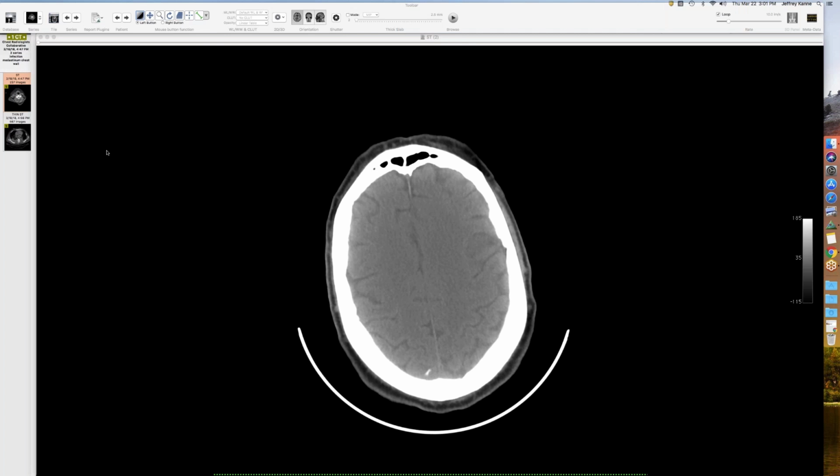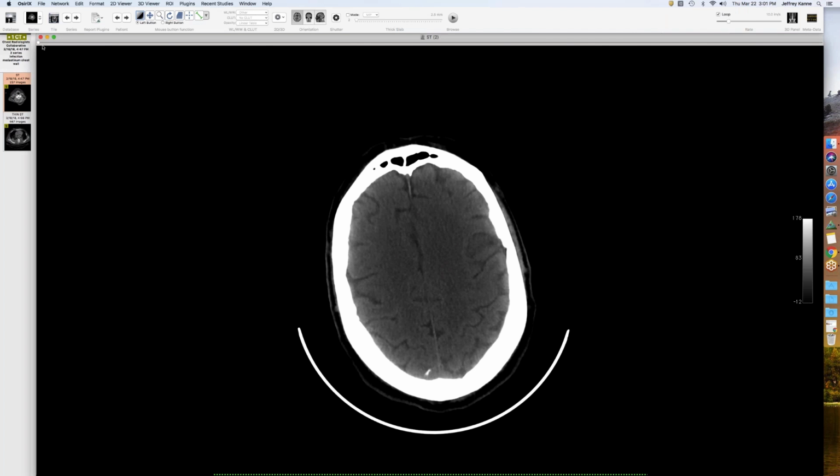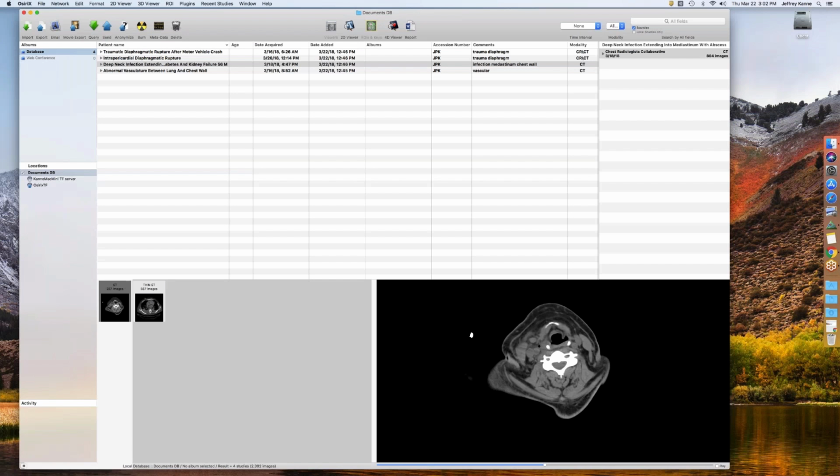Okay, makes sense. So it's basically a fistula, probably congenital. Congenital? Well, don't you think? Is that what you think, Jeff? No, I think it's probably acquired. Or acquired. It's sort of all these little tiny vessels, as opposed to a sequestration where you have one big vessel from the aorta. It looks more like a pseudo sequestration, but without underlying inflamed lungs. So that's why I wonder if maybe it was the sequela of a lupus pleuritis. Yep, prior pleuritis. Okay. The pleural surface was irregular there. That does suggest there was prior inflammation, and this is, as you're saying, Jeff, neovascularity. This is not congenitally factory installed.